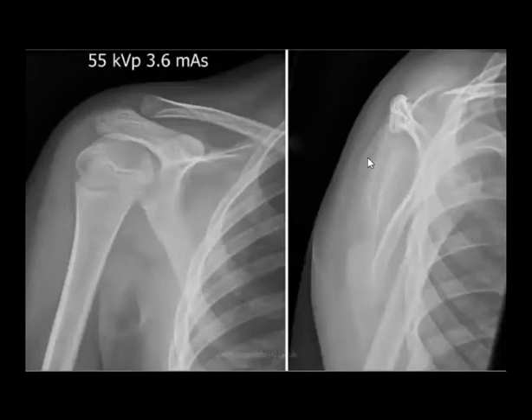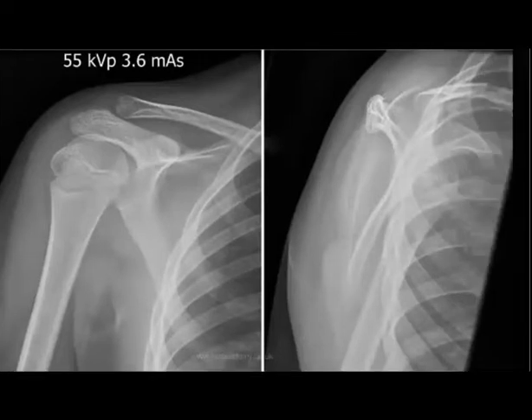Yes. So for example here, what do you think about this case? I will wait for the first star who can catch the abnormality. I will give him 10 big flowers, the first star who catches the abnormality.